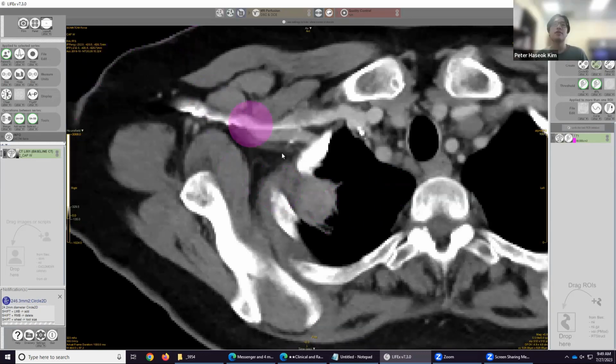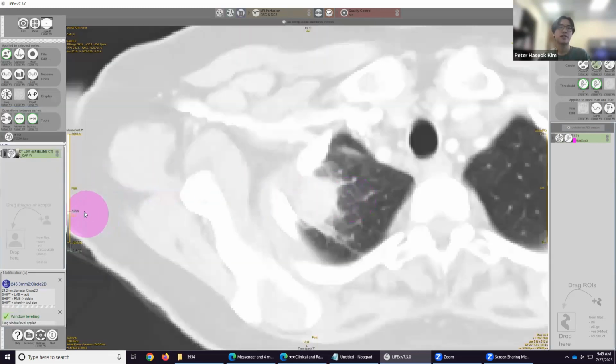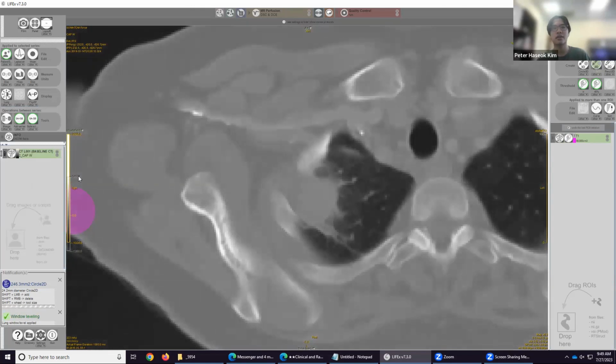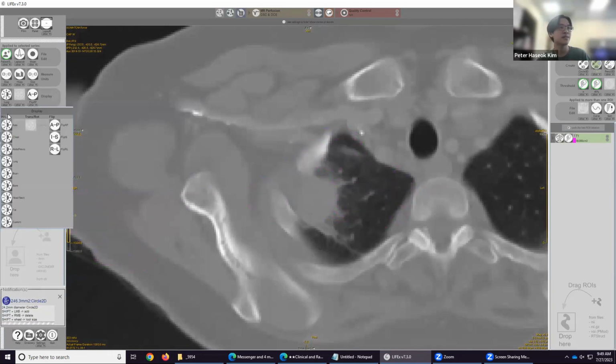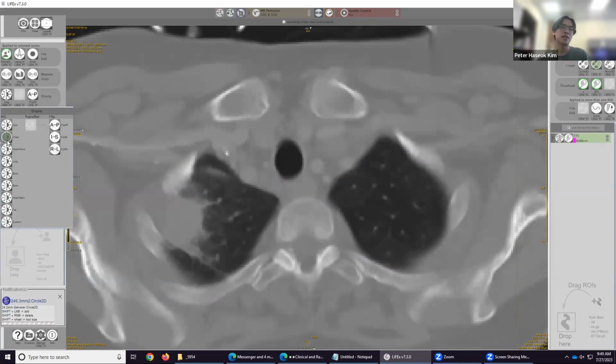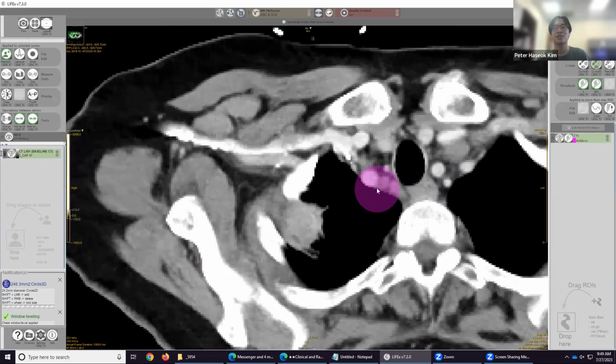There's a bunch of views that you can use for the CT scan. We usually focus on chest, just because lung is helpful to identify the lesion, but when this software extracts texture like radiomic features or texture in general, it's not using the lung view, it's using the chest view. So if it doesn't appear on the chest view, let's say here I see a ground glass lesion or whatever it is, and I segment it on lung view, what the machine is going to pick up is in chest view anyway. If it doesn't appear in chest, then it's just going to exclude everything you segmented.